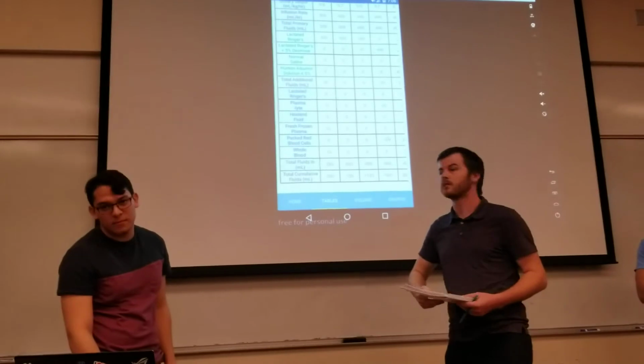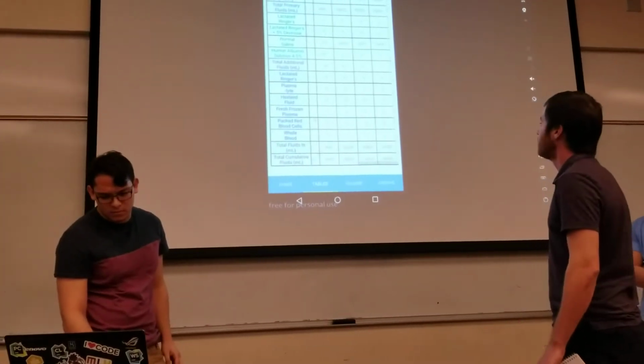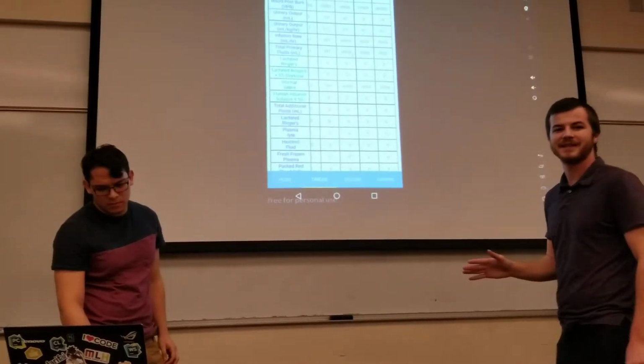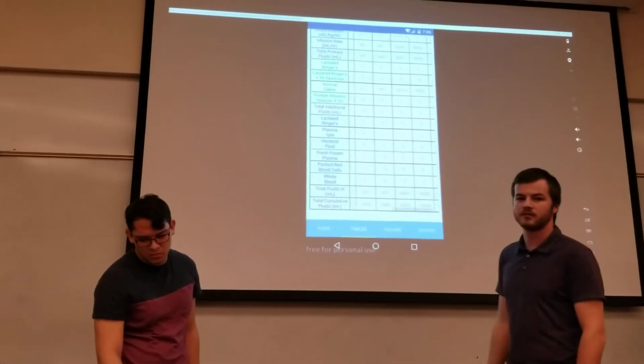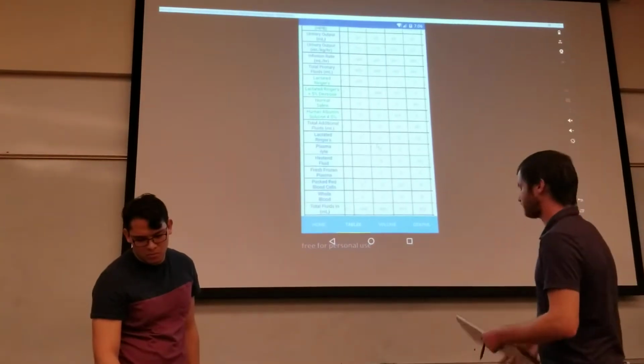So can you scroll again? Yeah. Scroll to the tape. Yeah, I see the scroll bar. In most situations, I don't think the doctor would use this many different fluids. So there is a lot of data in this graph. Usually there would be a lot less because the doctor would probably stick to a more uniform type of fluid, I would think. I see.